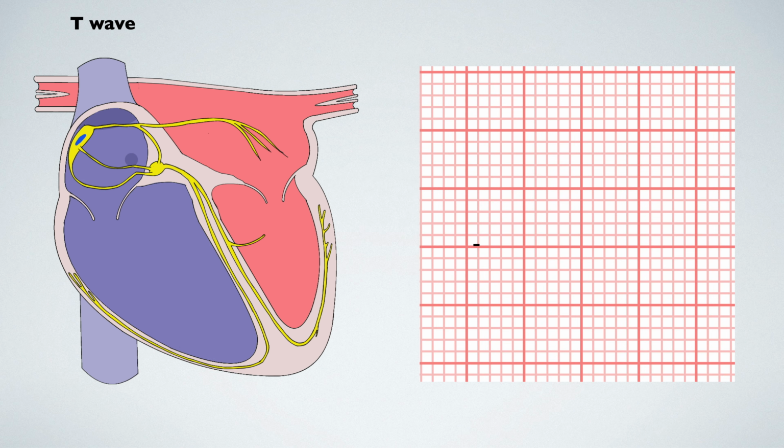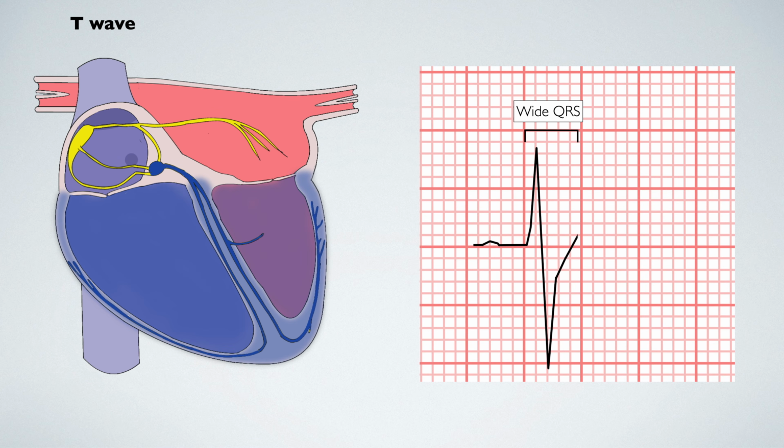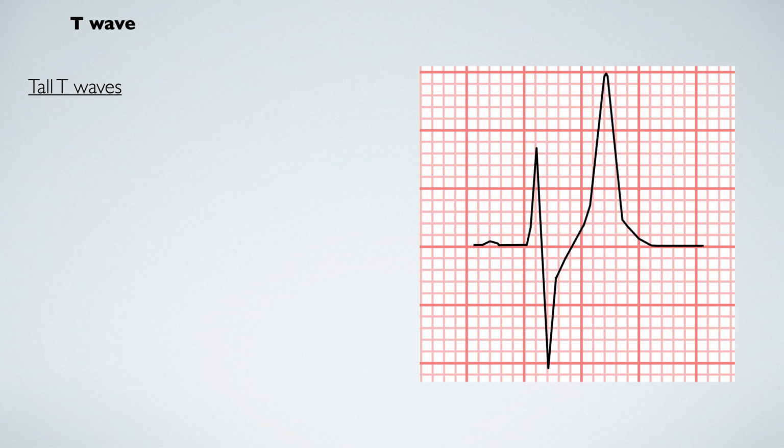We'll take a closer look now at the ECG features of hyperkalemia. The electrical activity will flow through the normal pathways, but the slowed conduction produces flattened P waves, prolonged QRS complex, and the rapid repolarization time produces very peaked T waves. The ECG criteria for peaked T waves are as follows.